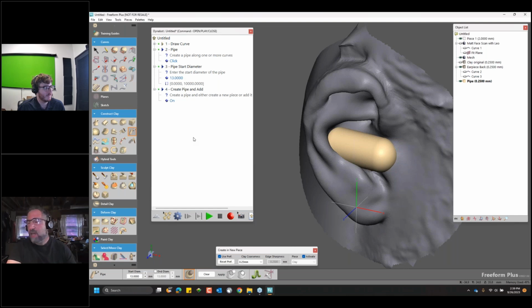These are steps that can be basically pointed to and said, these are what we're doing, we're following this, we have all of the data, and there's no room for human error in these parts because the system is well configured to handle that.